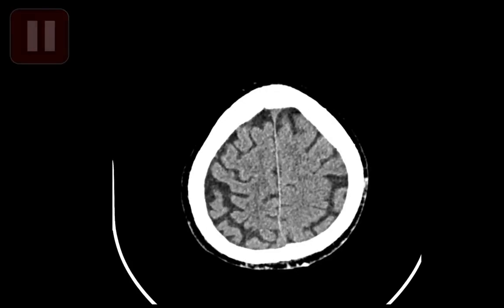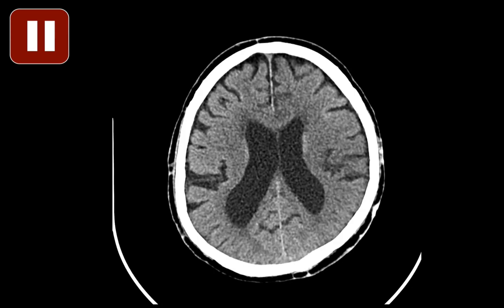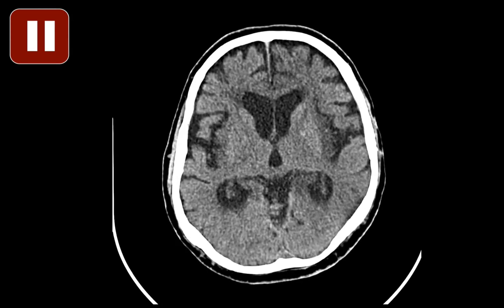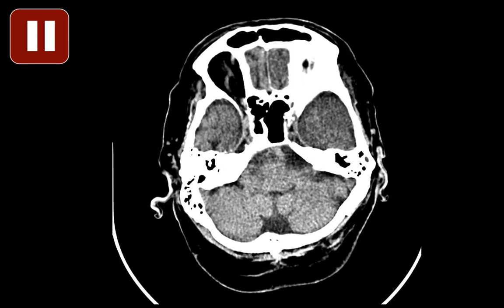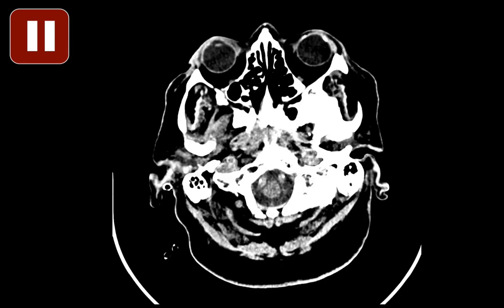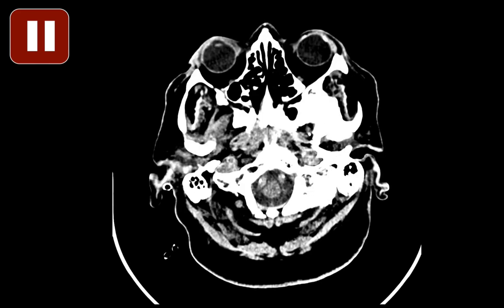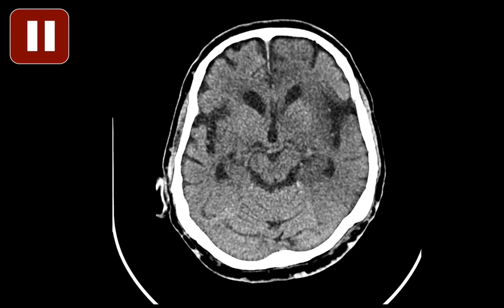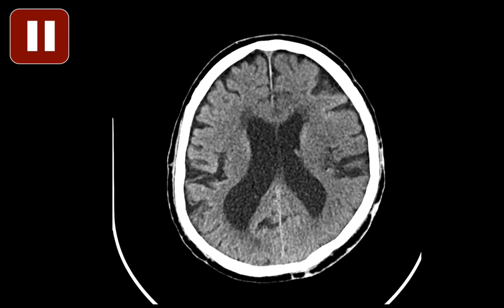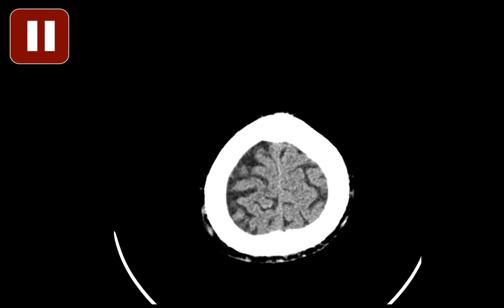This is a CT without IV contrast administration on a 74-year-old male patient who presented with acute confusion. So let's start by discussing the findings.